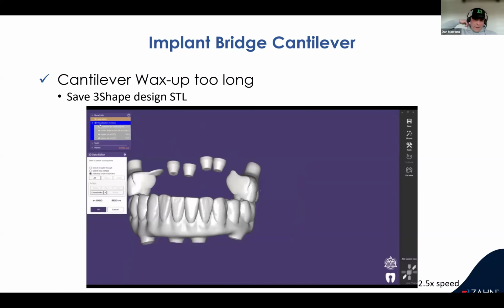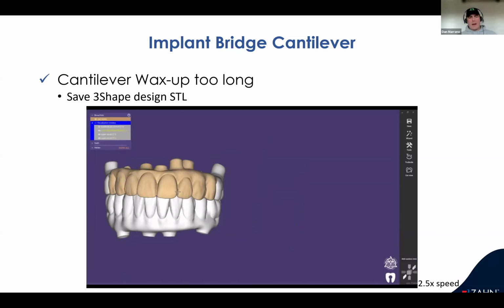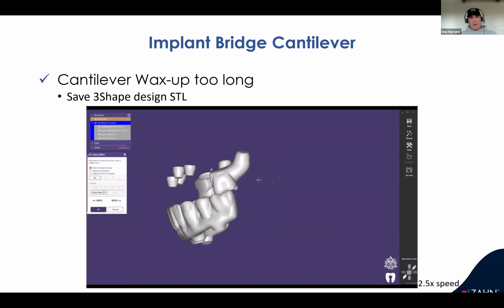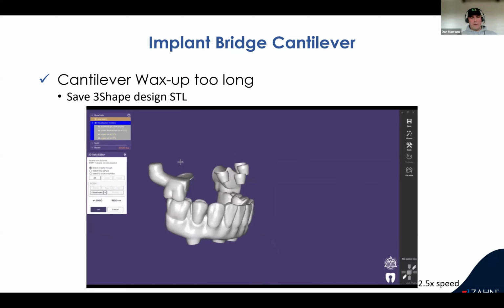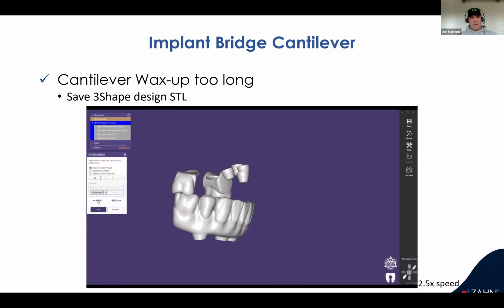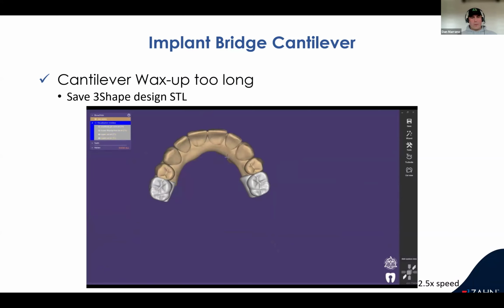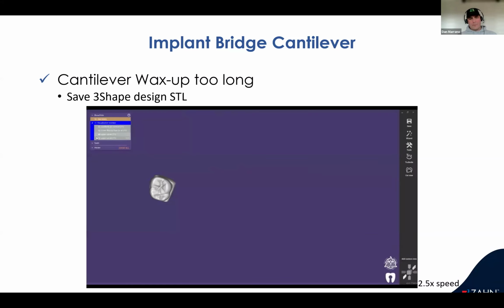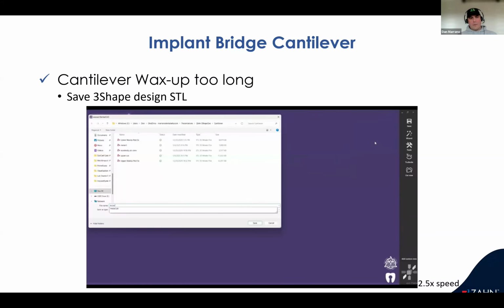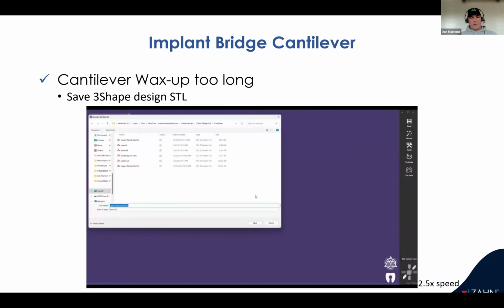And in this particular case, I think they lost a pterygoid. They weren't going to use that anymore, so we couldn't be that far back. Just cleaning up, I saw a little piece hanging there. We'll cut the pterygoid extension off. Same thing here. Close the holes. Now we have 3 pieces. Now we have to save those 3 pieces. So save each molar, save that front section.